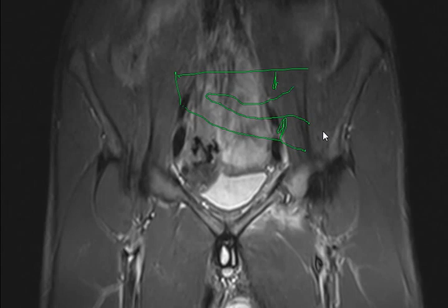And we are thinking of a pathological fracture, because of the bone expansion, bone interruption, surrounding edema, surrounding enhancement, everything goes in the right direction. So now, why, pathologic fracture, we are saying metastasis, right? The most common cause of a pathological fracture is metastasis. So why would the metastasis happen in only these two locations of the same bone, of the same side, and everything else is very normal? I think we have an etiology of stress fracture on this side.